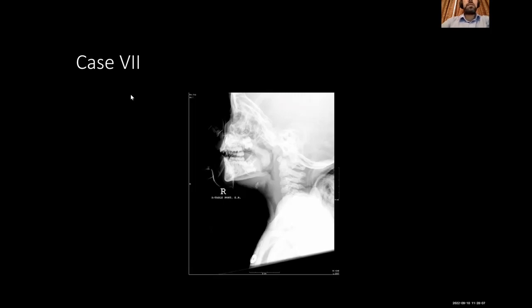Epiglottitis. This is an emergency. Abscess? It is centered in the epiglottis. This is not an abscess. This is epiglottitis, and it is an emergency. This is a very clear structure on the X-ray. Epiglottitis.